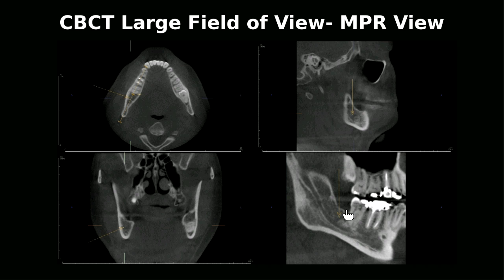I asked the patient how the extraction was. He said it took at least 5 hours to finish the surgery, and the patient actually had to say, I cannot do it anymore, so he left. When they took the tooth out, in the number 32 area you can see that the root tip was left behind. They saw the root tip was missing and knew it was inside the socket. They tried to take it out.